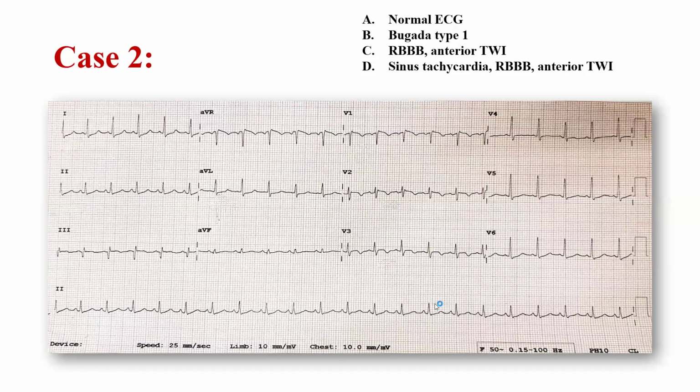I'd like to request Dr. Shariful Halim to comment on the ECG. Yes, I'm online. Can you hear me? Yes, please. Thank you for allowing me to describe this ECG. So this is a 12-lead ECG with normal paper speed and normal voltage calibration.